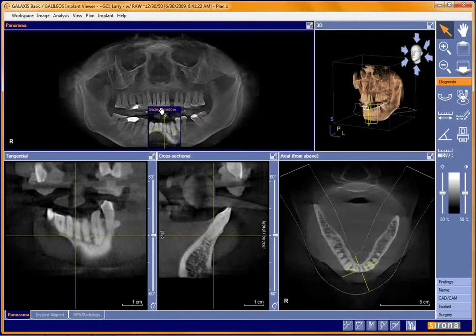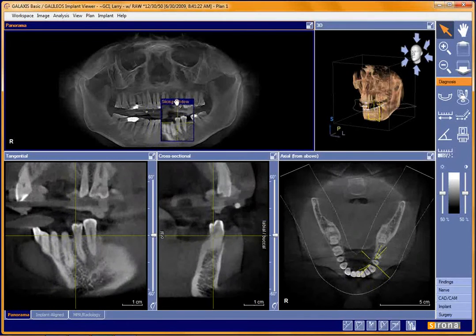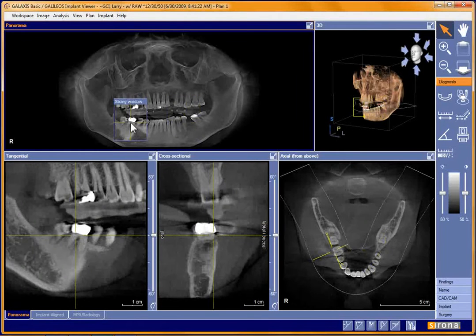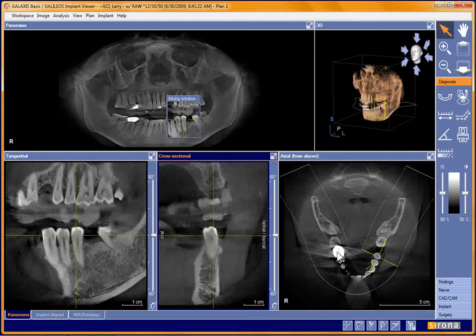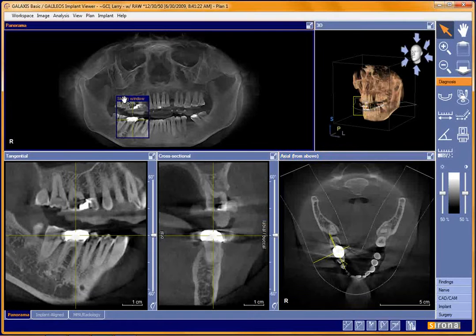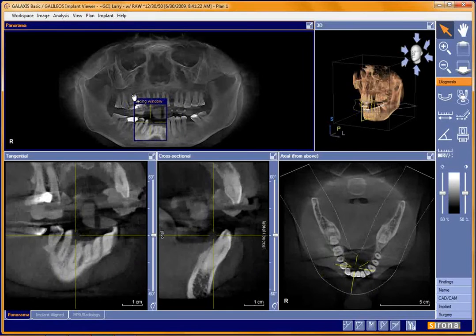You'll start to learn that you don't need to use this little slicing window by left clicking the top and rolling over, because you can just quickly go to any area you want to see by just double clicking on the area, and you can do that on any window. So if I want to look here or look here or even look over here, I can move very quickly without left clicking and rolling this back and forth over the panoramic curve.